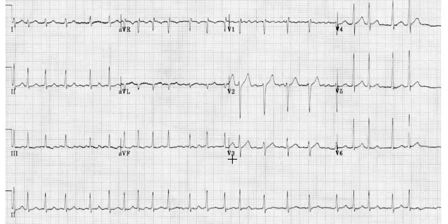A lot of students ask me how to calculate the heart rate when the rhythm is irregular. Like here, this ECG shows atrial fibrillation. In atrial fibrillation, or when the rhythm is irregular, and in bradycardias, we simply count the number of QRS complexes in this rhythm strip, in 10-second strip, and multiply it by 6.